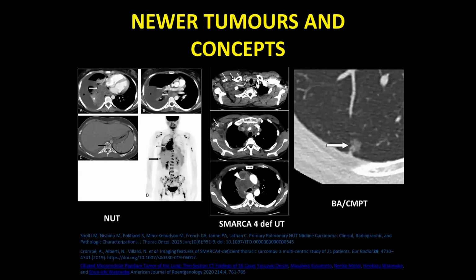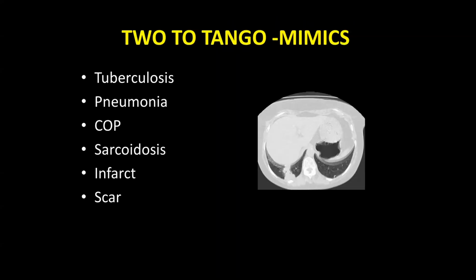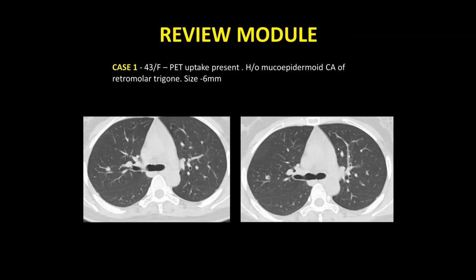Histopathological types, we are not really saying it, although many times in our mind we keep thinking, yeah, this is likely to be adeno, when we are seeing all these kinds of patterns. I don't know whether we can raise that possibility maybe, but there is so much overlap.